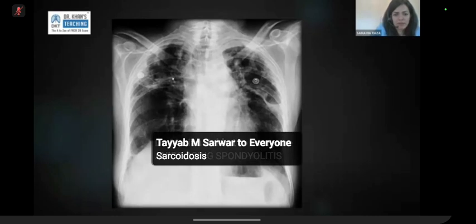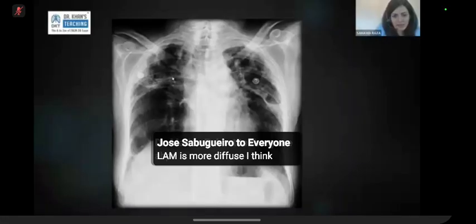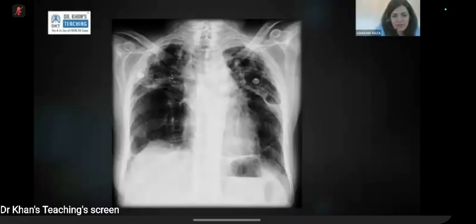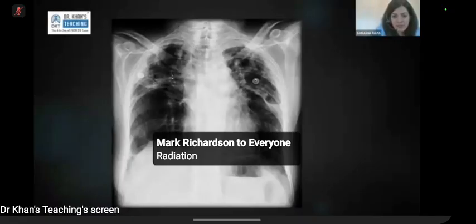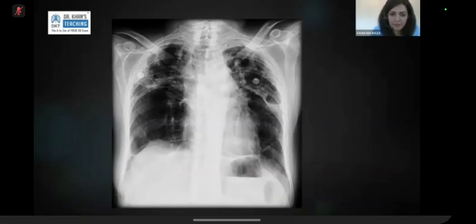Okay, perfect. Thank you. It's great to see all of you engaging with the chat, and all of you are giving very good differentials. Somebody has said advanced hypersensitivity pneumonitis, and I would really encourage you not to use terms like advanced. It's either acute or chronic or subacute. We'll come to HP in a bit, and hopefully by the end of today's session, you will know what to call acute and chronic in terms of HP at least. Yes, the differential is absolutely right.